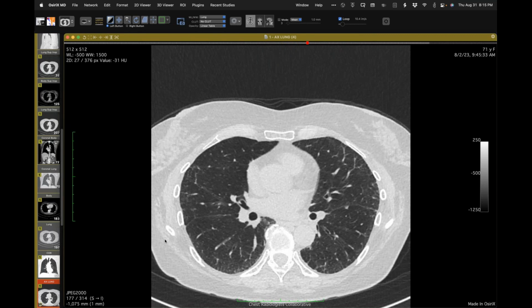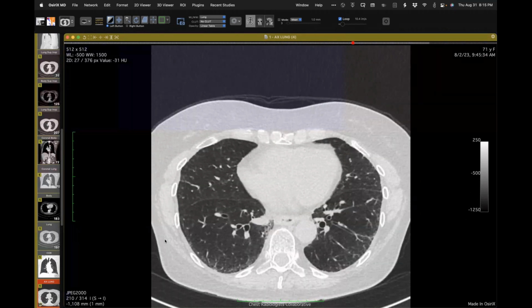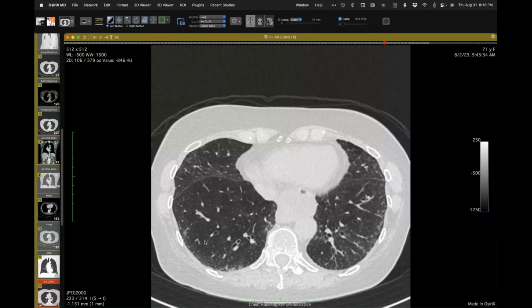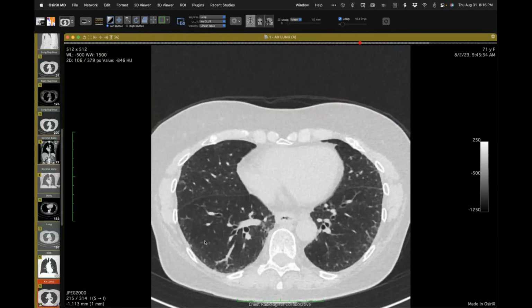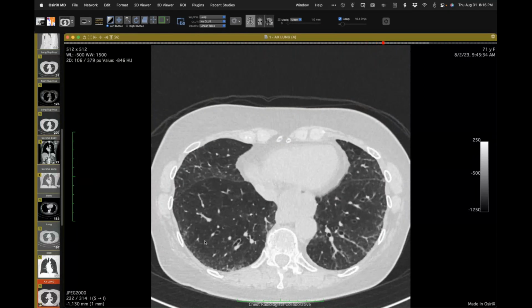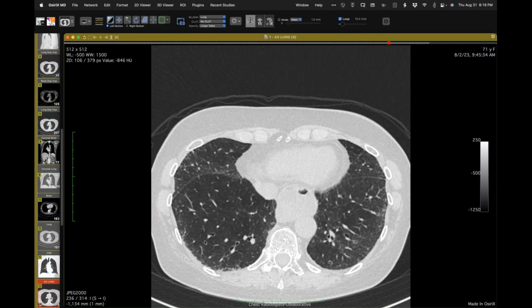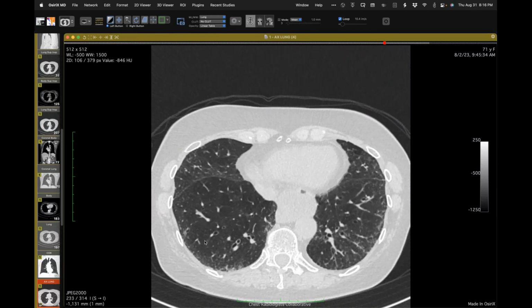Yeah, I mean, there's a lot of debate in the pathology community, even about the entity of fibrotic hypersensitivity pneumonitis, how to make the diagnosis. But certainly they look for airway-centered fibrosis, in particular, one of the things, in addition to things like poorly formed granulomas. And certainly one of the things that we look for, for sure, is a pattern of fibrosis. Well, this is really a mild case, but we look for airway-centered fibrosis.